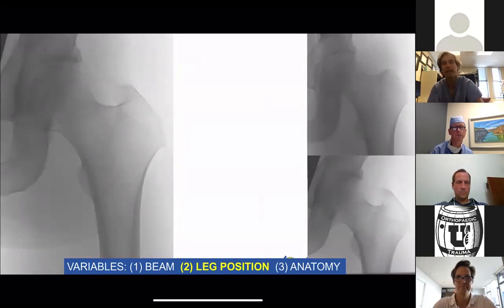I have to admit, I didn't understand this very well. I was in a session with some really good hip surgeons, master hip surgeons, and they were talking about malreductions, and Keith Mayo piped up and said something about the shape of the proximal aspect of the neck and why it was like that because of the malreduction. So looking at AP, you have the ability to judge the sagittal plane.